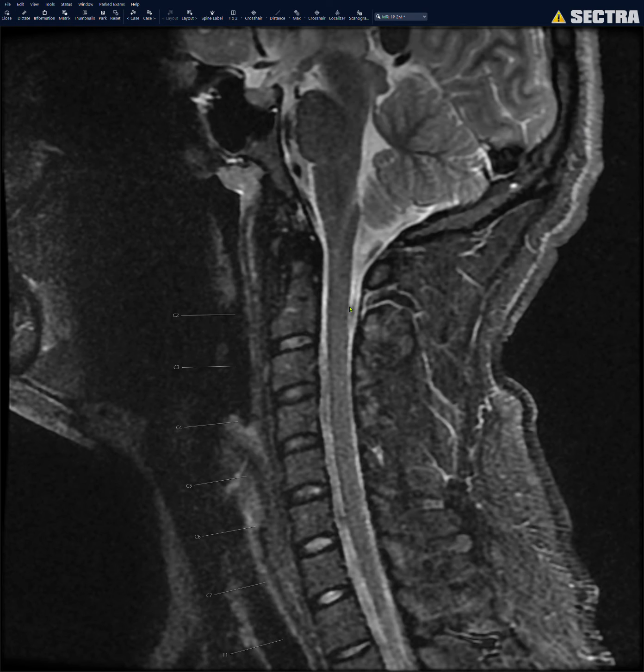Okay, and now I look at the craniocervical junction. I look for any kind of edema at the craniocervical junction. It's normal to get some bright signal in the basion-dental interval. It's not edema, it's just some bright signal on STIR; anatomically, that's just the way it is sometimes. At the basion-dental interval, that could be normal.